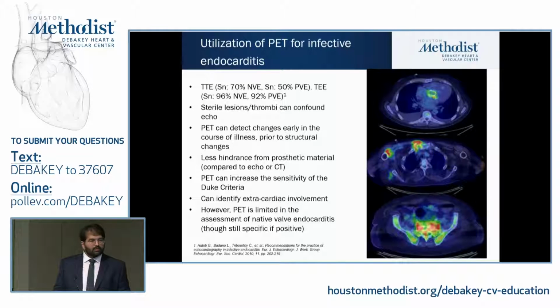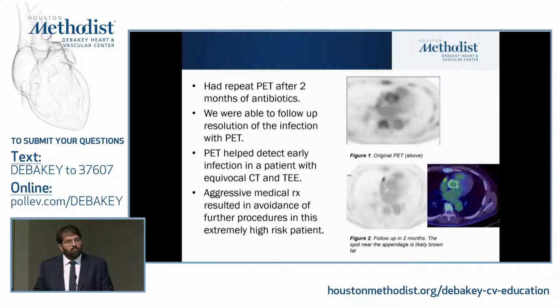But how about that uptake in the vertebra? Yes. So we see a lot of non-specific uptake in the bones, different organs. Usually we have a threshold. A rough guide is the intensity of the liver. If it's more than that, then it's usually considered significant uptake. But also, if it's very homogeneous and smooth uptake, like you see in the vertebra here and in the sternum, that's usually something that you're less concerned about.